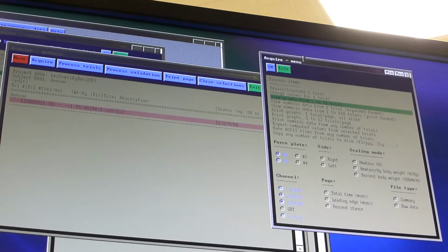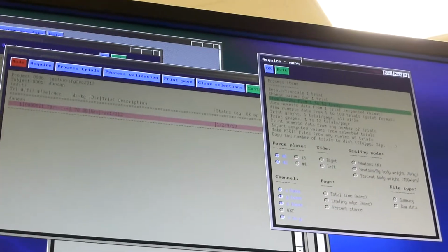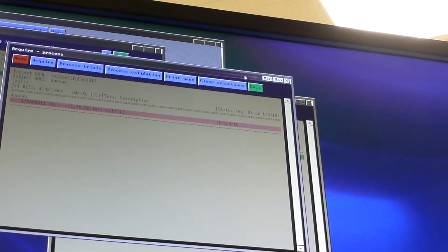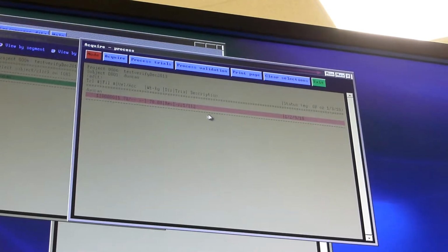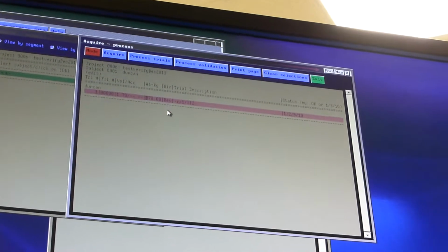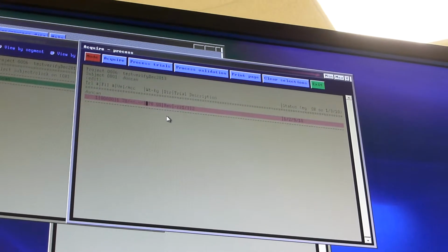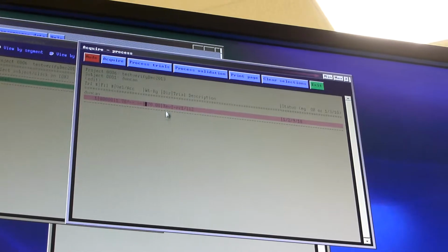Okay. Let's look at a couple of other things. Can you go back to the page that showed the list of trials again? Yes, got that. There is a column just before trial description. It's called DIR, direction. And it's either FWD or REV. At the moment it is REV. This is the program's assessment of which direction it went. And so you'll see a mix of those if you do different directions. If you always go the same way, it should always be the same.